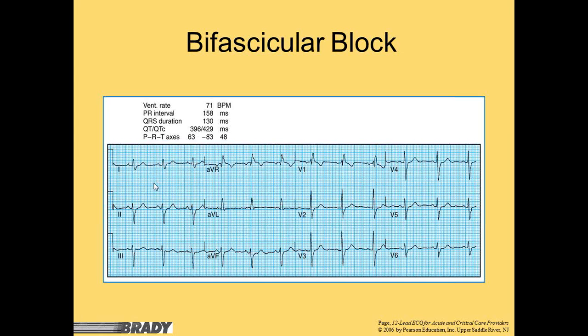So looking at your handy dandy little box that we had last week, if you have that handy, it'll come in nicely for this one. If you look at that little box, you're going to find that we do have a block here, and that block is going to cause us some problems. So if we have an upright and then down and down, we know that this is an anterior hemiblock. And so then looking at the axis deviation, a negative 83 fits in that negative 40 to negative 90 anterior hemiblock category.